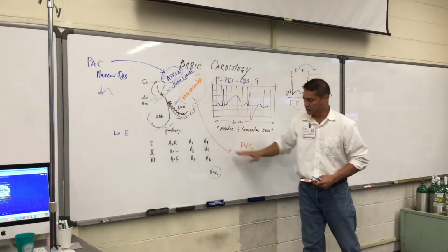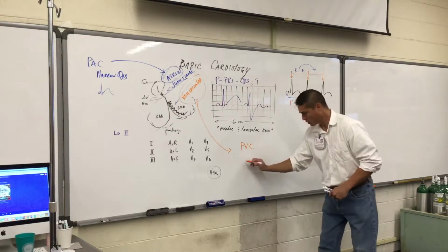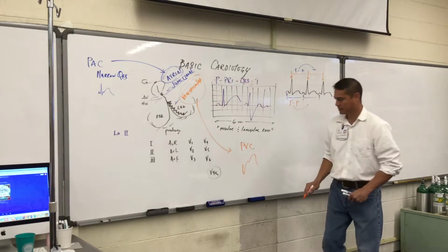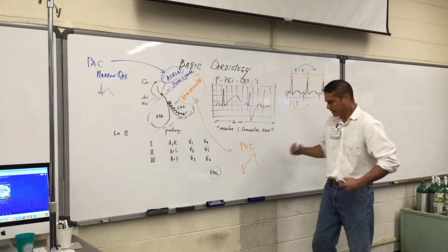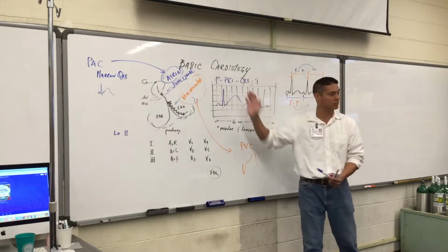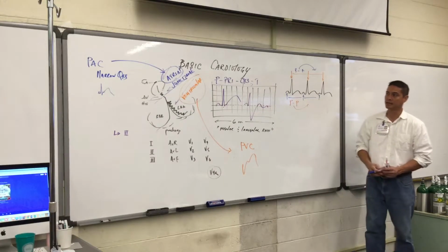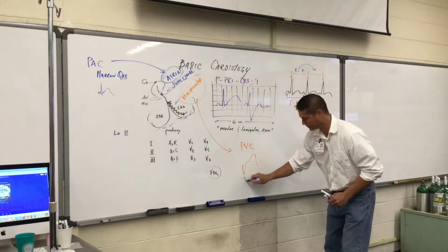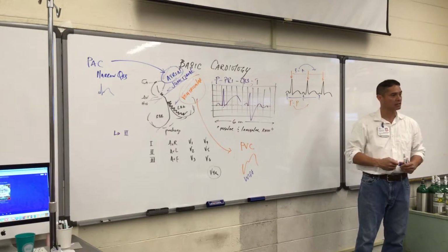And if it originates from the ventricles and it comes early, it's called a premature ventricular complex. And as a result of this, we might not have a P wave. What we might see is just a type of widened QRS complex. And it's wide, and when we look at it, it doesn't look like the normal sinus beat that we've been looking at. That's basically what we're trying to figure out in basic cardiology, is to understand what the normal basic rhythms look like. And anything abnormally wide, let's wonder if that's coming from the ventricles and it originated in the ventricles.